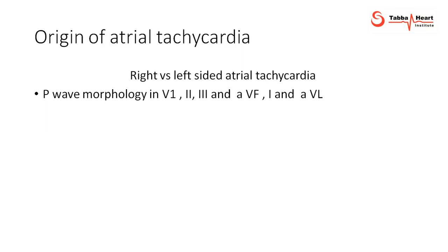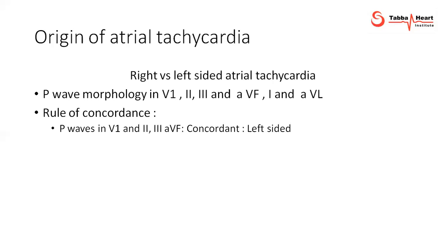Over the years, I have learned from my mentors that the rule of concordance holds true for most of the tachycardia, right? For the concordance, you have to look at P waves in inferior leads and P wave in V1.